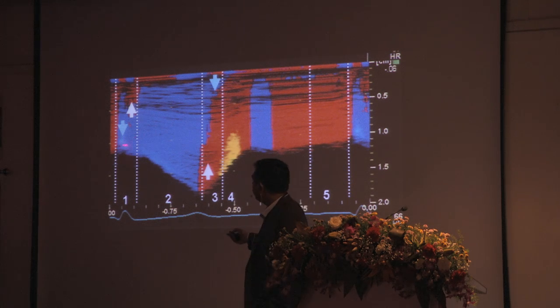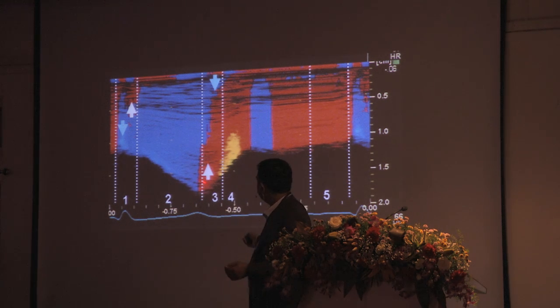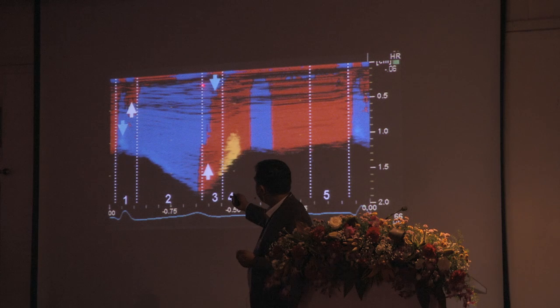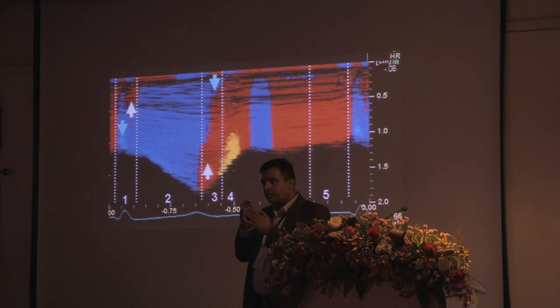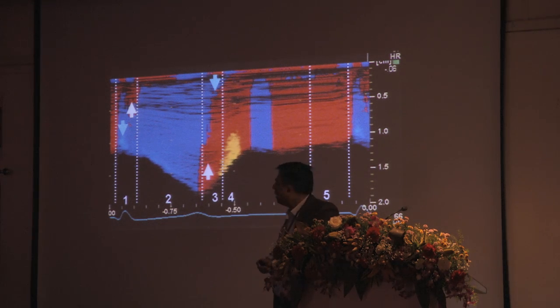So this is one peculiarity which repeats again in the isovolumic relaxation period. You can see here in red that the endocardium is actually relaxing, going towards our probe, which is placed here. So red is anything that's towards the probe or relaxing. At the same time, the corresponding epicardium is actually contracting. Again, as I told you, this is a result of the double helix. Just keep this in mind because we're going to come back to this when we see our strain and strain rate curves.